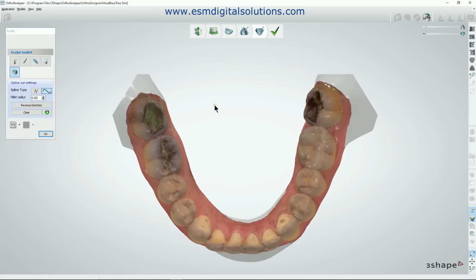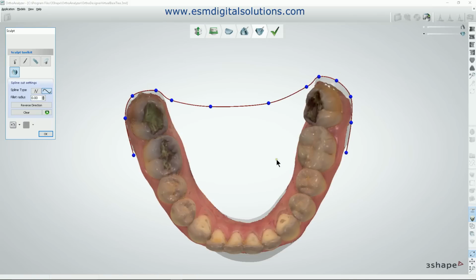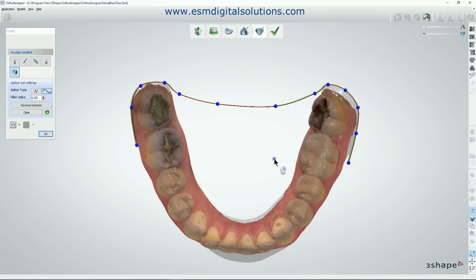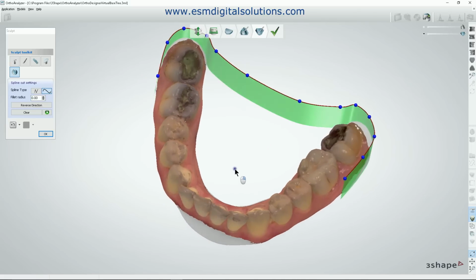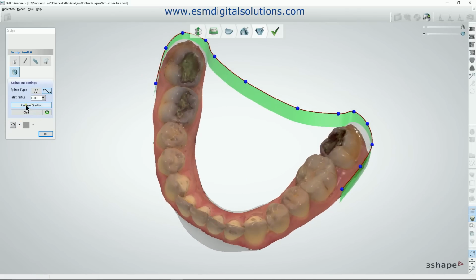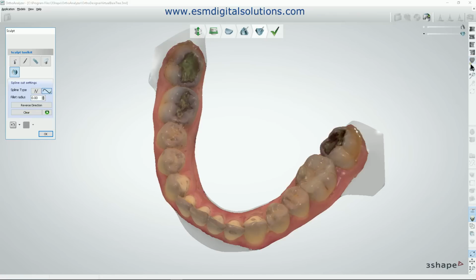Take a true top view, and again starting off the model. Click our points, and then click apply. If we double clicked on that last point, the software would join it right up to the first point, and again we'd have a closed loop, i.e. just keeping a chunk out of the whole arch. Again, that looks good. One other thing I do want to show you is, let's clear that again.